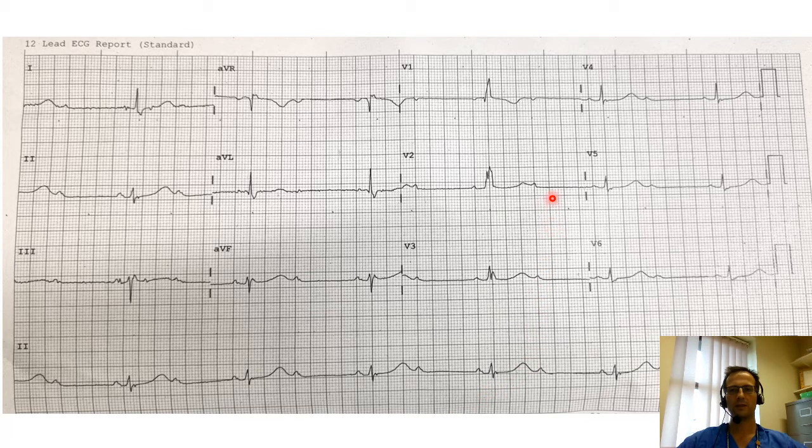So I'll start off by talking about the QRSs. Can you see that this appearance is a little bit atypical, but there is perhaps a tiny R wave followed by an S wave followed by a larger R wave, so our RSR pattern. And we've got a small S wave in V6, so this is right bundle branch block with a broad QRS.